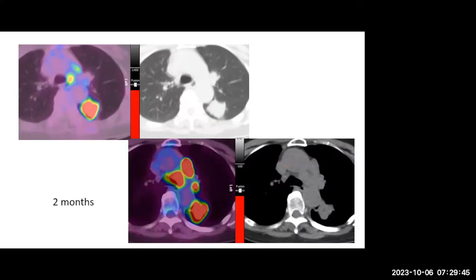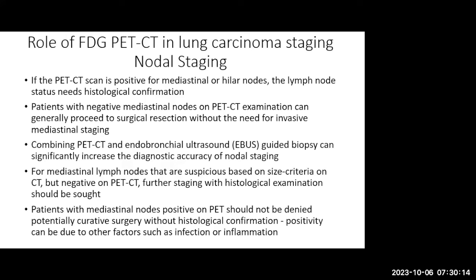And if you were to do only a CT at the beginning in the scan that I showed you, just based on size criteria, you could not call them metastatic disease. So that's the reason why we have those so-called superpowers with the metabolic activity. And we many times could detect metastasis before they are visible and obvious on a CT. So that may account for what I showed you in that table of the better accuracy, sensitivity, and specificity of FDG as opposed to just a plain CT.